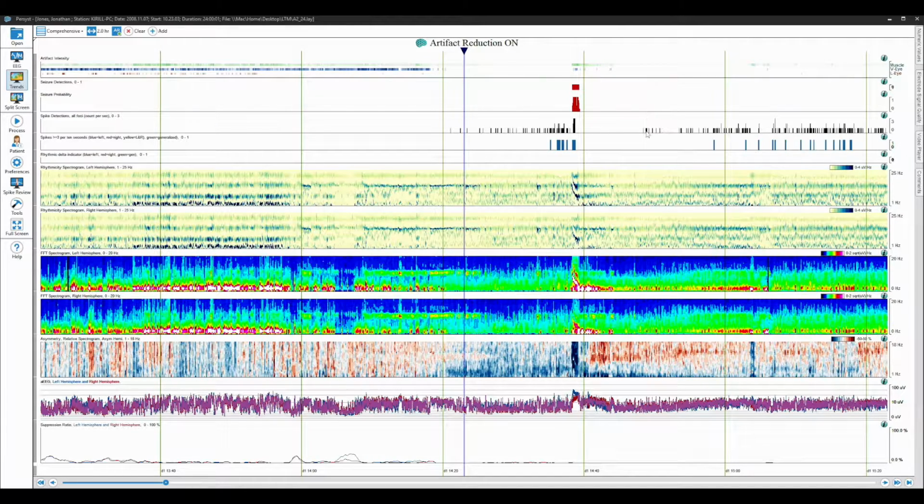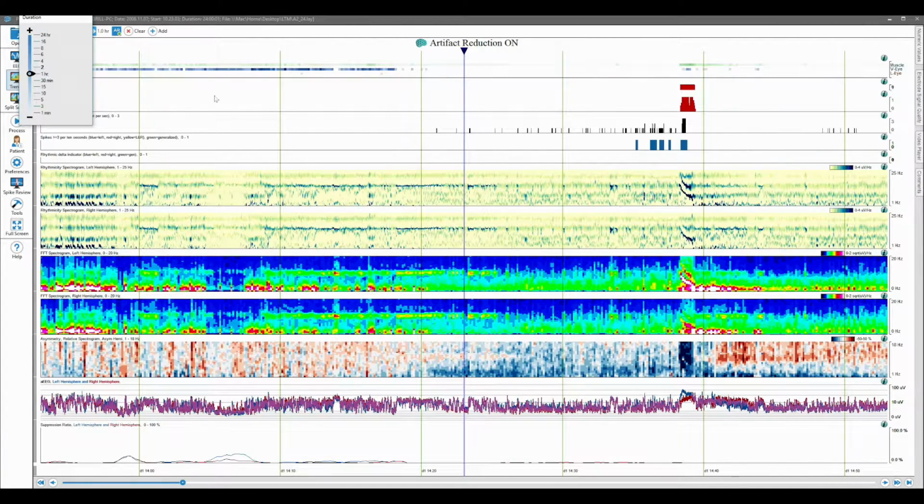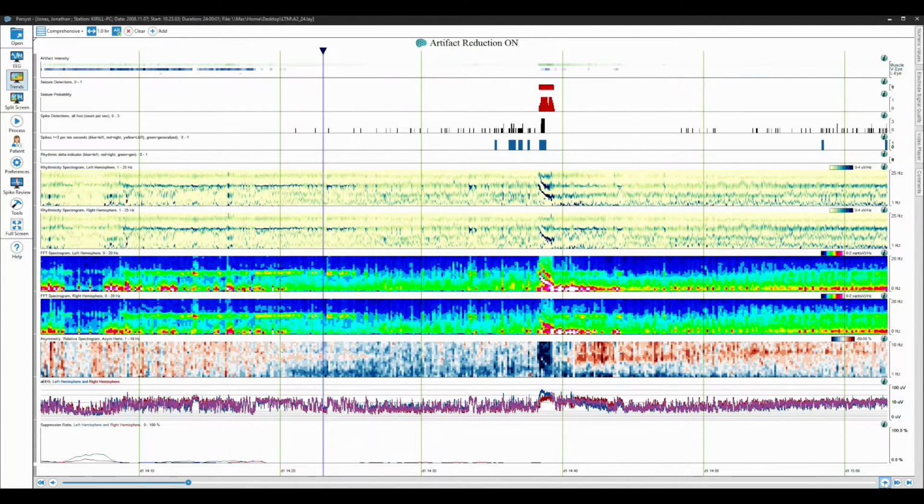The patient wakes up briefly and falls back to sleep. And the spikes continue, as we see looking at the rest of the page. If we look at the other trends, we can see related things happening. I'm going to change the time scale so we can see this a little more clearly. Again, this is the same pattern, just zoomed in a little bit.